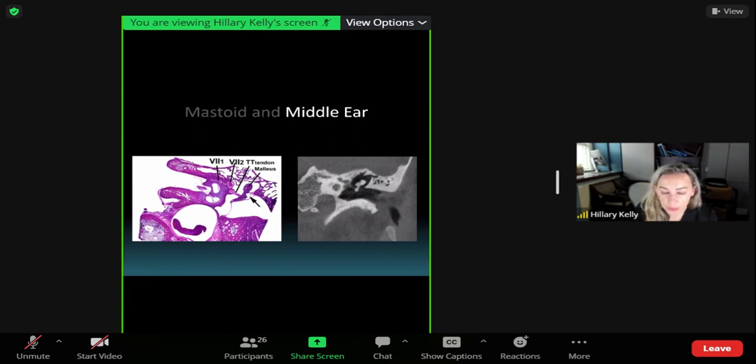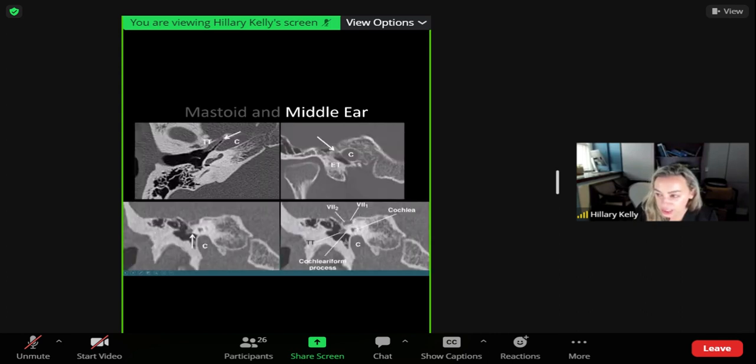These channels kind of lie one above the other and extend anteriorly and inferiorly between the squamous and petrous portions of the temporal bone towards the nasopharynx. The tensor tympani is a more superior structure and is smaller than the eustachian tube, which is here. Here's the tensor tympani, this is coronal, and here's your eustachian tube, and here's your carotid. And the bony structure separating these two is the semicanal of the tensor tympani, okay? This is the semicanal, and this bone is that cochleariform process, like we talked about before, all right?